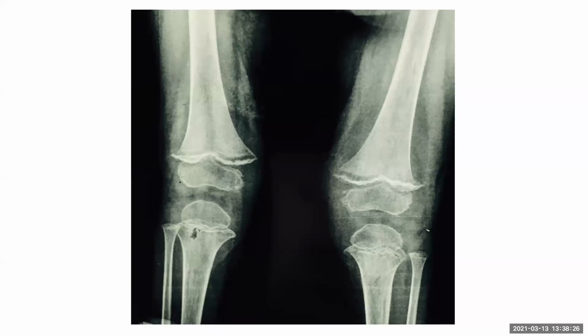So that sclerotic line is the zone of provisional calcification, the sclerosis. The radiolucent line is the Trümmerfeld zone, and the Wimberger sign is the dense, well-defined density along the epiphysis of the tibia. Also, I can see some periosteal elevation along the distal left femur that may indicate subperiosteal hemorrhage.